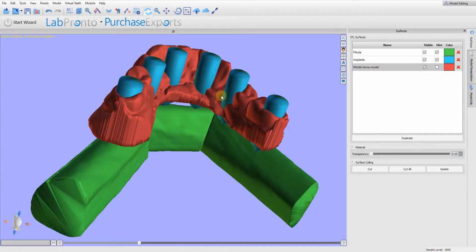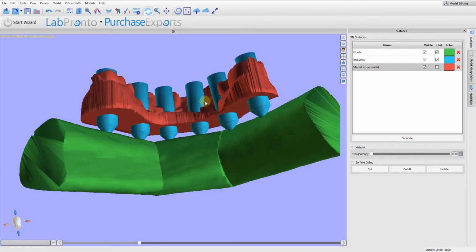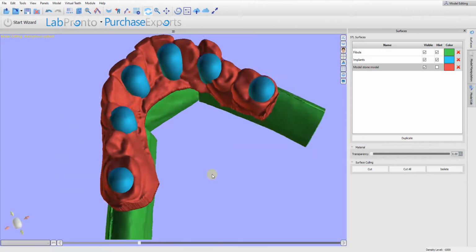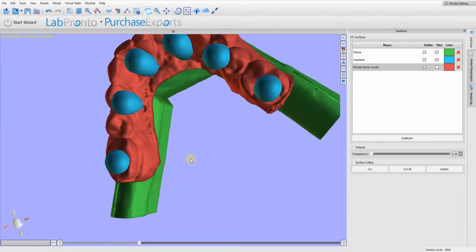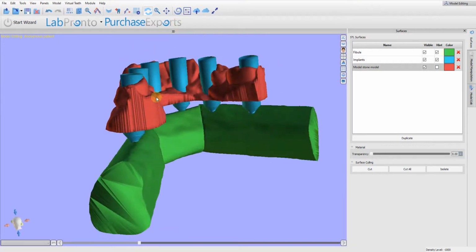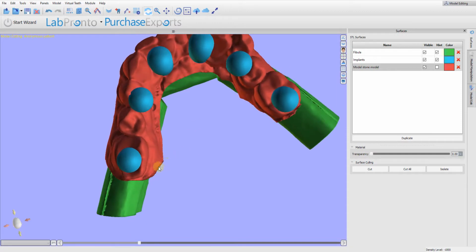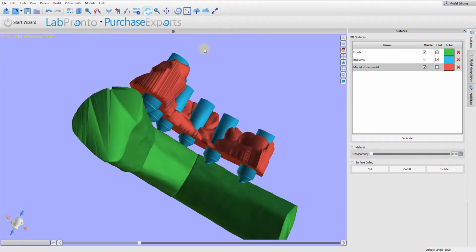And we're going to end up bulking up these areas around these implants a little bit here. I may trim off some of this lingual and actually the buccal also. So this cut is always made at the view you're looking at. So your cut is always made into the computer screen. So to make a cut along here, I'd like to make it kind of undercut slightly. And so when I look from above, I'm actually going to tilt it that way a little. Maybe a little much, but we'll see. And so if I kind of cut off that lingual aspect, yeah, that's not too bad there.